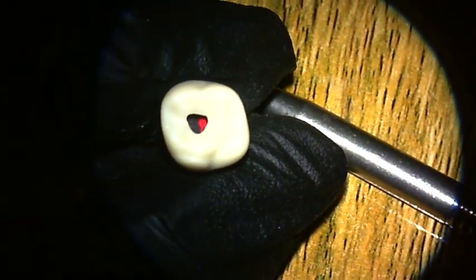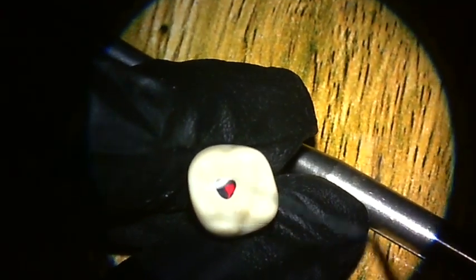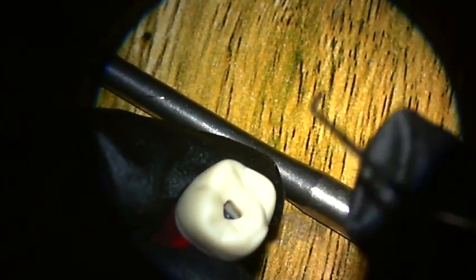Complete removal of the pulp chamber roof, no roof. Now when we say roof, that includes the roofs above the orifices and the internal wall, the lateral walls. Now, above the orifices, we just talked about it. This is the pulp horn part. In general, the roof, there shouldn't be any roof remaining that you can visualize, unlike the pulp horn above the orifices, which you may not be able to see except with a probe.